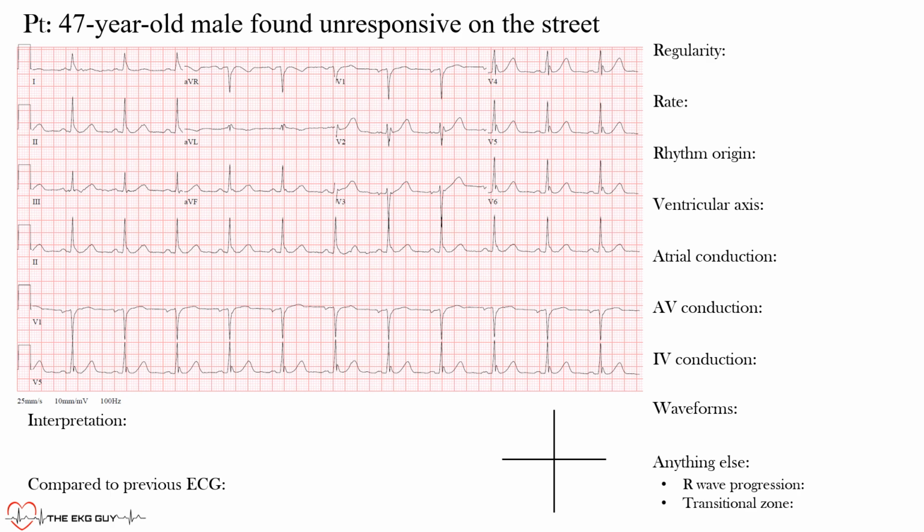All right, hopefully you had a chance to at least do as much as you could, trying to approach this on your own. So let's go through this. First, this is the approach that I use, and I think this is the most helpful. You'll have other people that are biased to their own approach, but this allows me not to miss anything on the EKG, and it's really held up quite well. So if you don't have an approach, then you could use this. It takes sometimes a little longer initially when you're starting, but that's the way it is when you're learning something new. So let's get going.